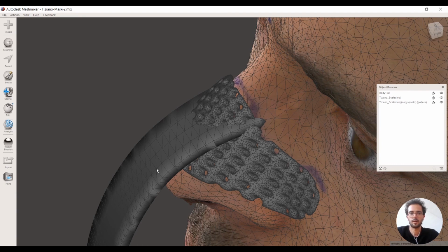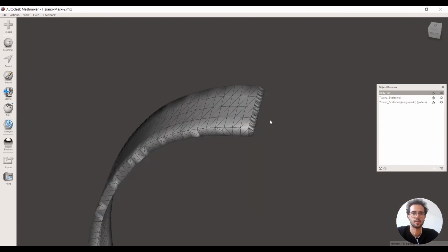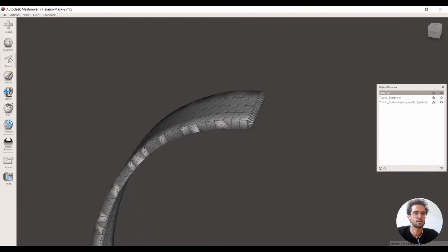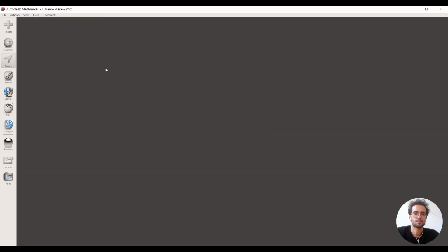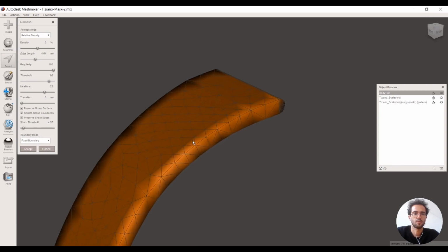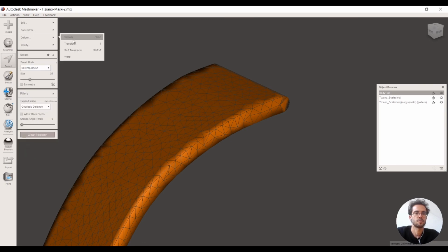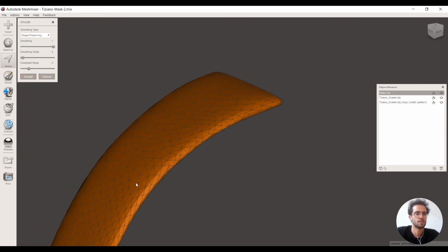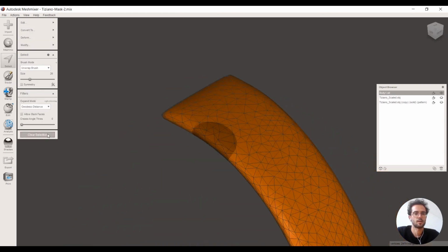Right now we can edit this thing a little more, so I just select this, hide the other part, and I want to smooth this a bit better. So select Command A, edit, remesh, and I want to increase the resolution a bit more, like 50%, maybe more, because it's easier then to smooth out things. Accept, deform, smooth, we can smooth this out a little more, accept, and clear selection.